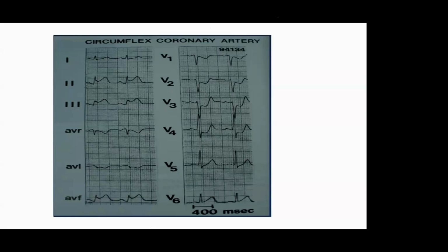Lead 3. This 3 is not more, no? Lead 2 is 1.5, lead 3 is 1.5. Okay, this is almost same. 2 and 3 are almost same.